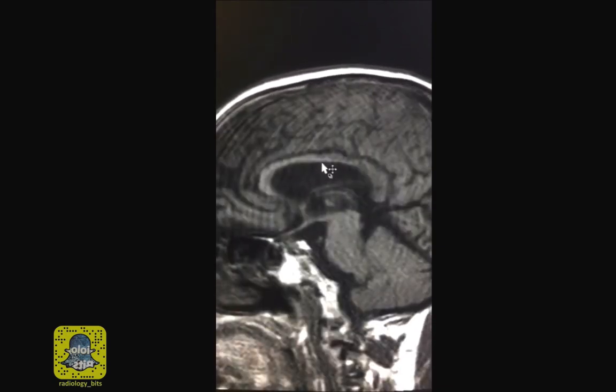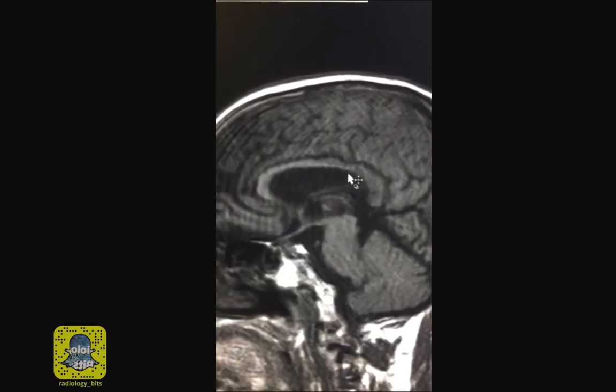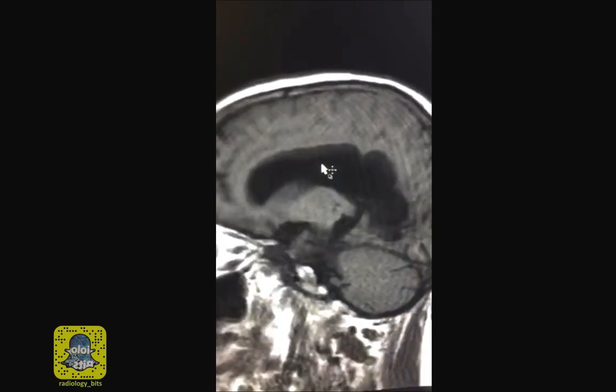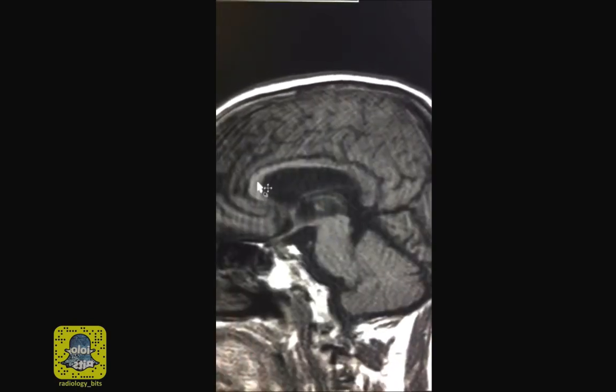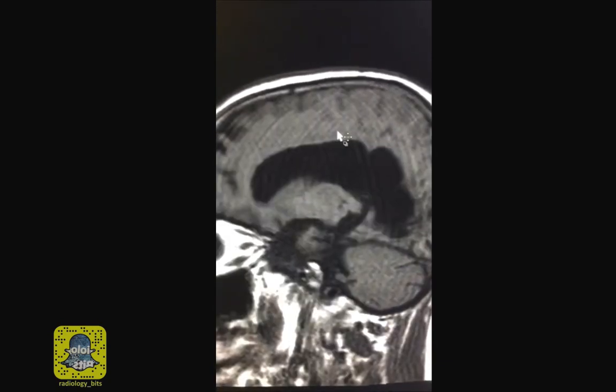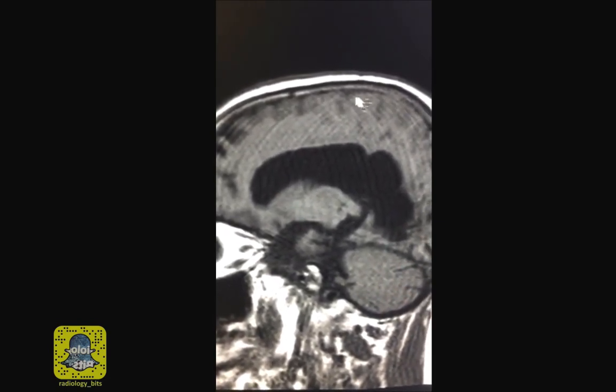Another interesting finding that you could see here is the scalloping on the brain, which you see here as well as everything is pushed upwards. Sometimes this is associated with thinning of the corpus callosum, which is mildly thinned here. And another point that we mentioned on the axial image, despite the volume loss, there is fullness of the brain at the convexity.